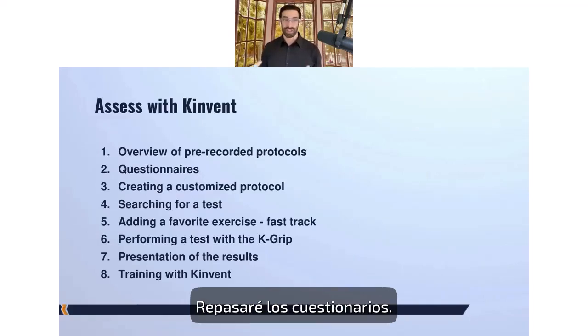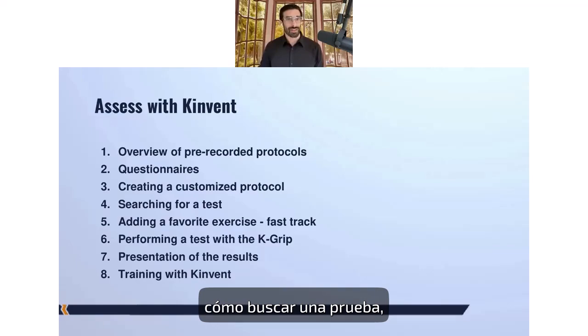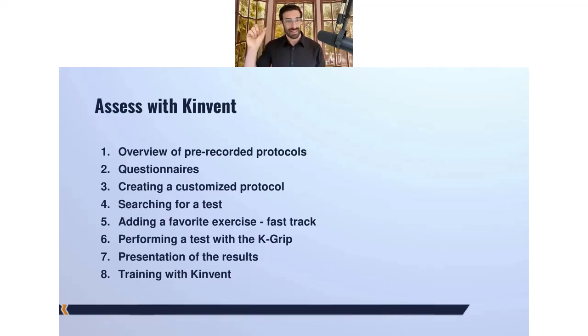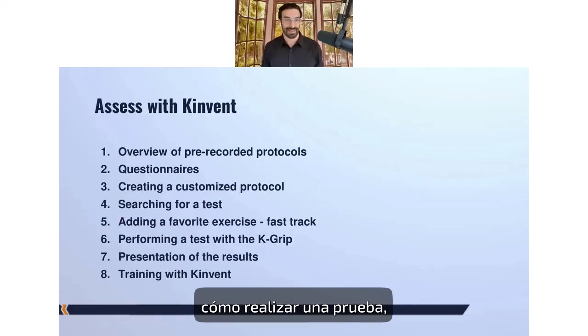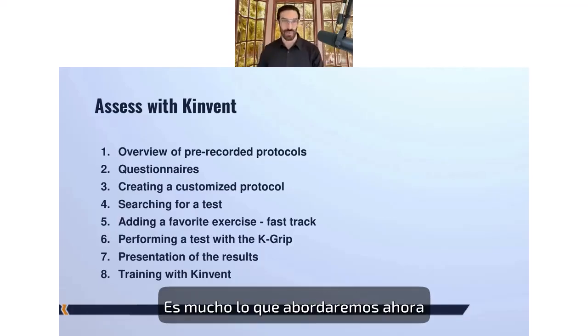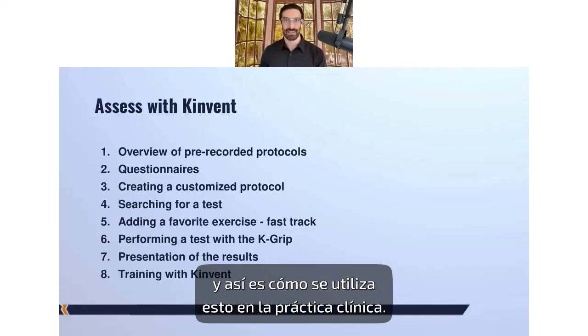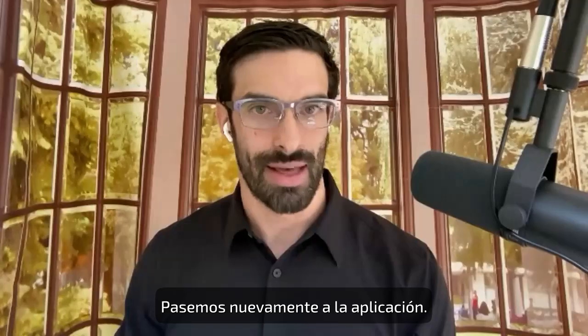I'll go over questionnaires. I'll show you how to create a customized protocol, how to search for an actual test, how to add your favorite exercises, how to perform a test, how to present the results, and how to train. So this is a lot that we're now going to get into. And this is really how you utilize this in clinical practice. So let's transition again to the app itself.